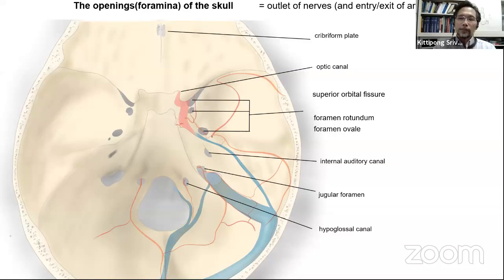This is more like the skull-base arterial anatomy. It's not totally related to the external carotid artery system, but these are the vessels that we have to be very careful about, because it's not just the soft tissue. Sometimes it has connections to the brain arteries. So those are the important things that you need to know.